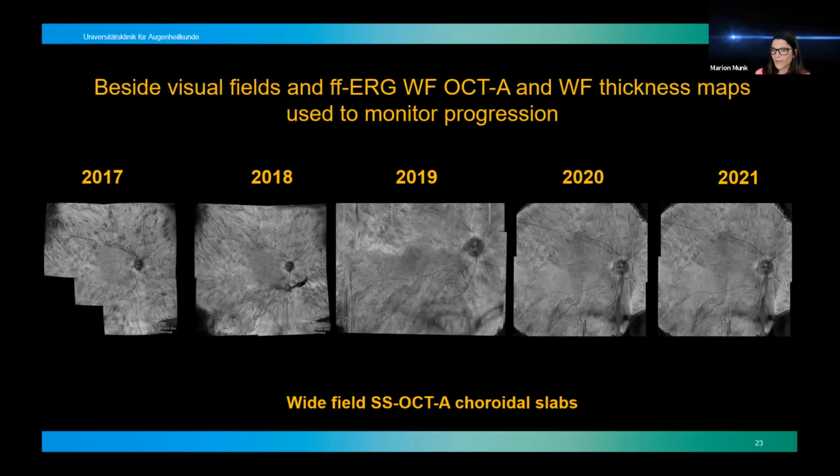And what we do now, especially in this case, but also in all of the vitreous cases, we use wide field swept-source OCTA to follow disease progression and treatment efficacy in these patients, together with full field ERGs and with Goldmann perimetry.